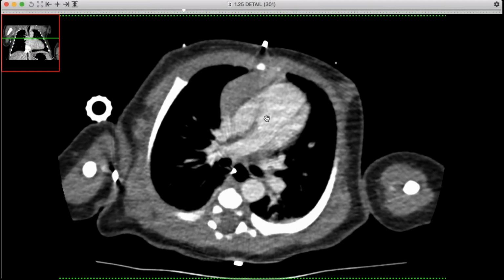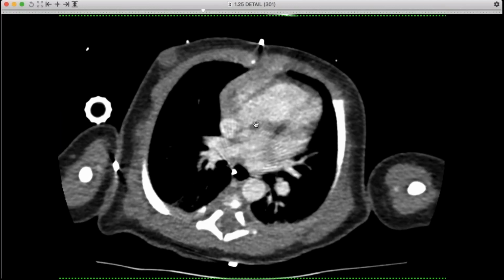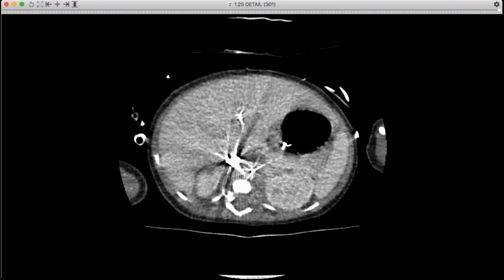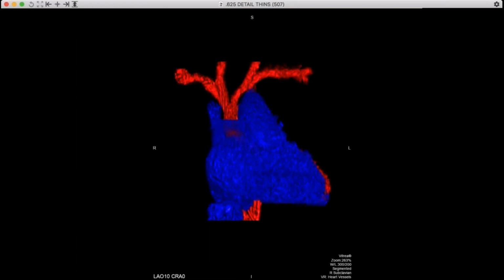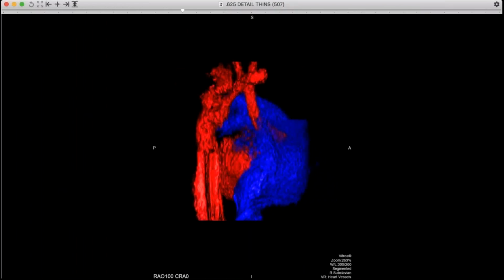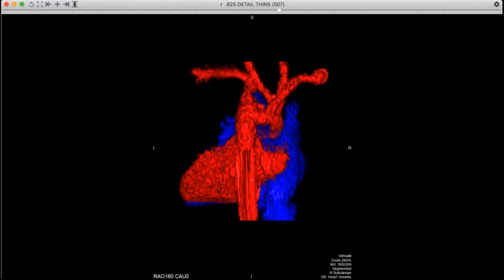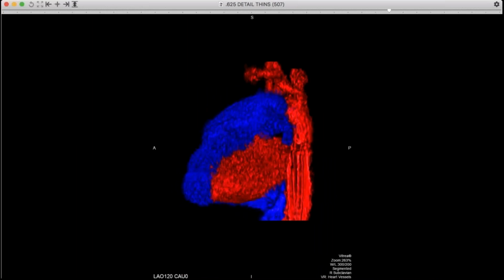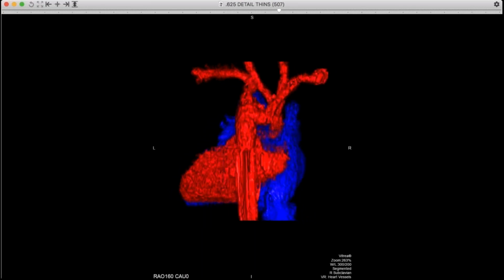But what's cool is there's a single vessel coming off the heart there, and I think it shows best on these 3Ds. Oops, I can show them. Look, there we go. Yes, single vessel coming off. So there's the descending aorta. So this is a type 1 truncus arteriosus.